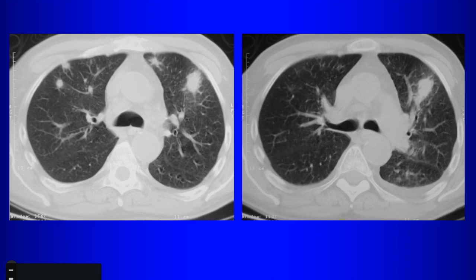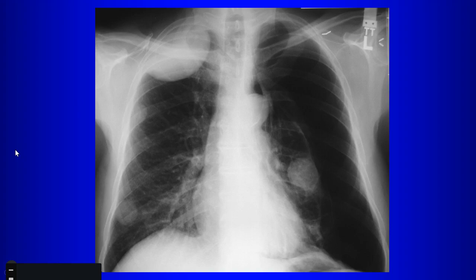So what are metastatic tumors associated with hemorrhage that can be associated with ground glass? Renal cell. Renal cell, so you think of vascular tumors, what other tumors? Melanoma. Okay, what else? Melanoma is always a good answer, and you have a strange appearance, and what tumor can do this? Choriocarcinoma in a female, right. So choriocarcinoma is also notorious for being associated with hemorrhage around the metastases, right? But any hemorrhagic tumor that's metastatic can also do that. In this case, that was invasive aspergillosis. What's peculiar about this case? Your pneumothorax and what?